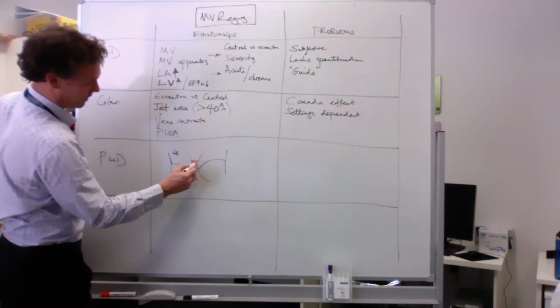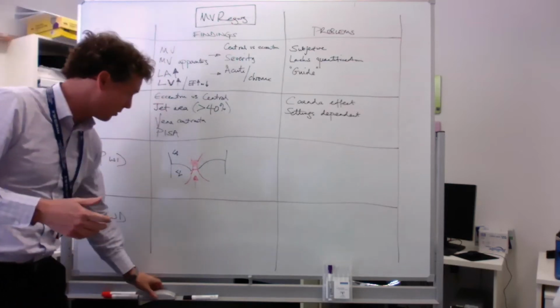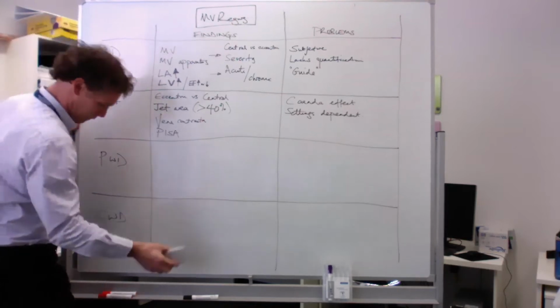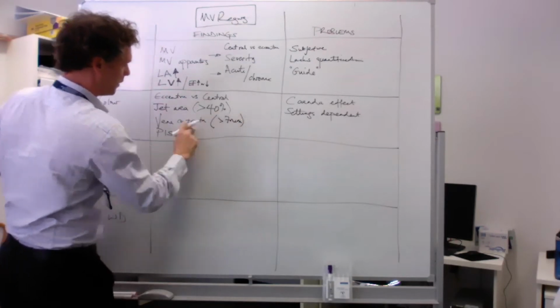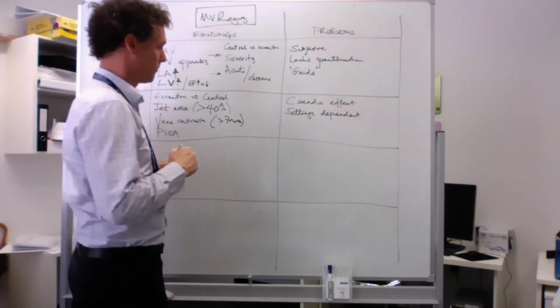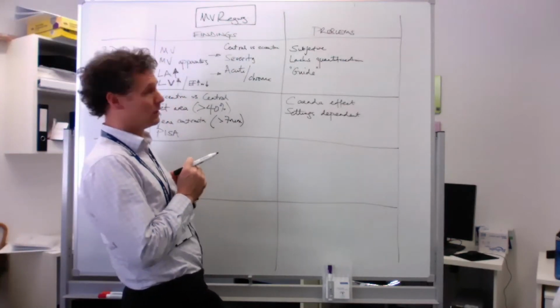Oh, sorry, I've done badly there. So it's actually in there. Okay, not actually at the point there. Yeah. And what's severe? Greater than 7. 7 millimeters. Good man. And what's the problem with that? It is settings dependent and operator dependent.